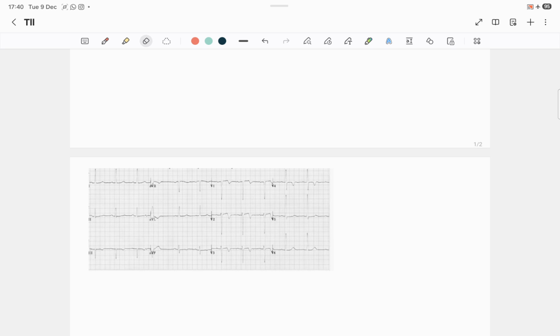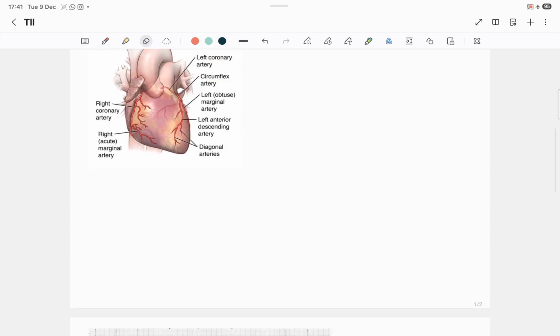We are worried because this is typical for the left anterior descending artery whispering, really, saying I'm about to close. And if you miss it, this can turn into a full anterior MI, right? And also you can see V4 is showing that pattern as well, although I'm going to show you the two types of Wellens, and then we can decide which type this is. But let's talk about the left anterior descending artery.